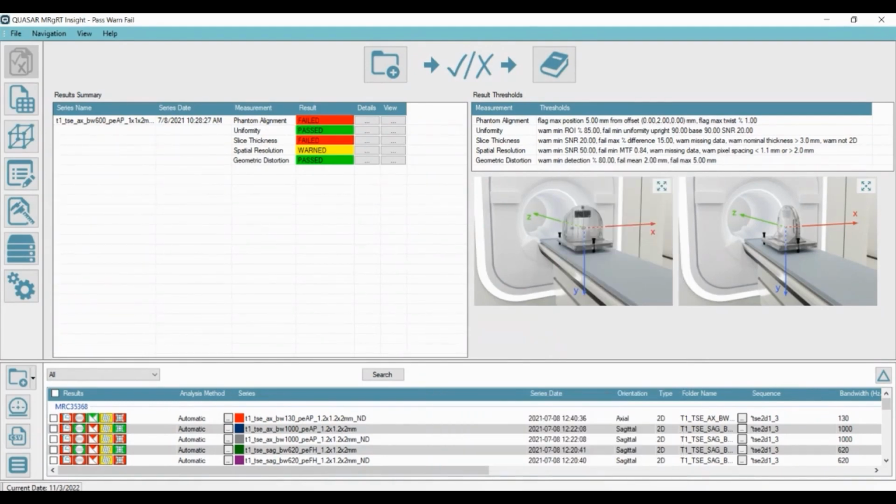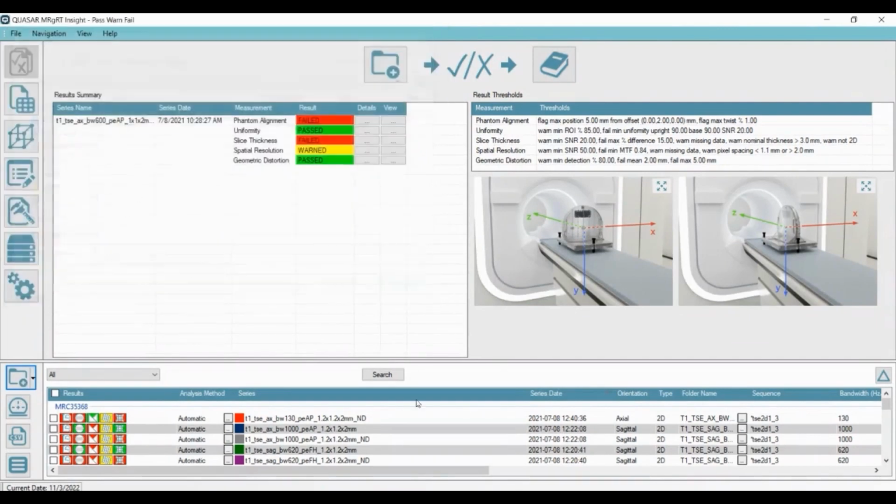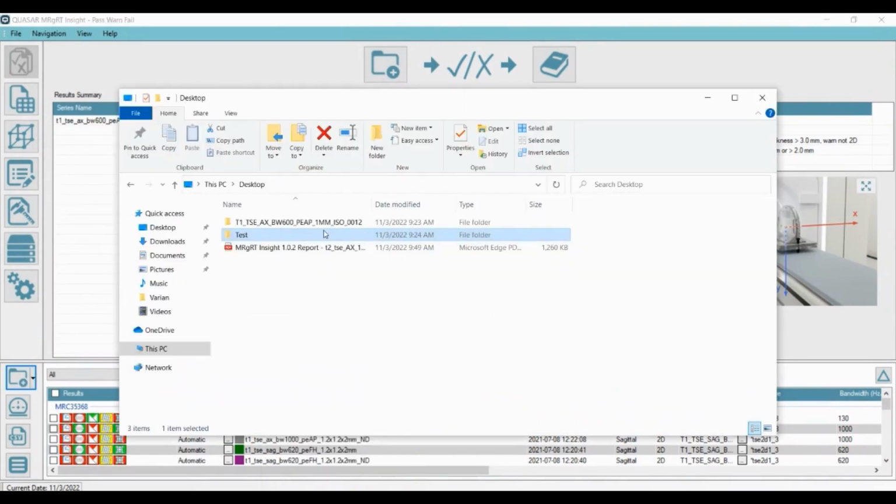Now, this is quite a straightforward process, as you can import them simply by clicking on this button towards your left-hand side and directly selecting your DICOM folder, or optionally, you can also open up your Files Explorer and then drag and drop your folder of DICOMs into either the main window or into the data browser below.